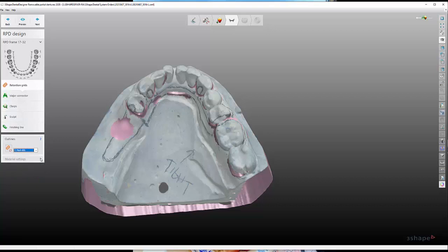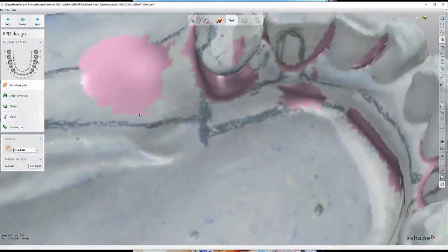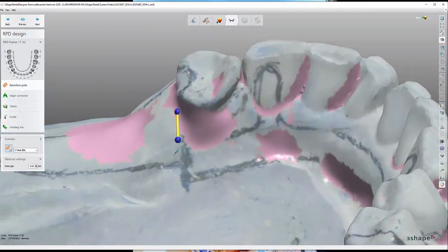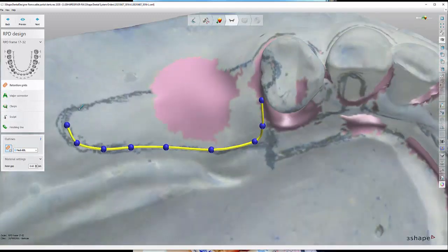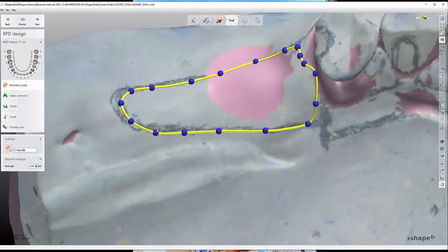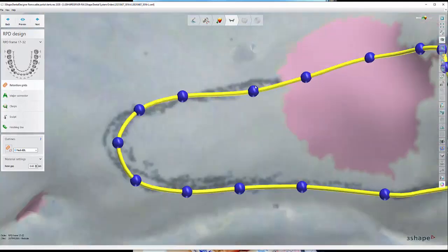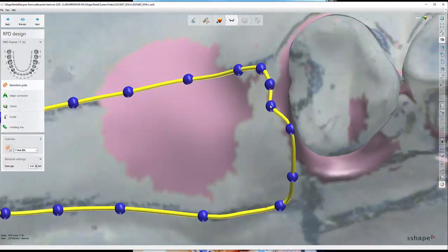Our second default here is 0.60. That for us means regular sheet relief or regular spacing. We do sometimes go up, and when we have an increased thickness that we want, we actually write H for heavy on the model, and we go to 0.8. And if there's a T, that means thin, and thin is 0.4. So that's the kind of breakdown. 0.4 is thin, 0.6 is regular, which is 95% of cases. H is for heavy, and that's 0.8.